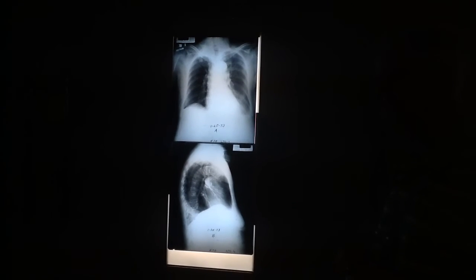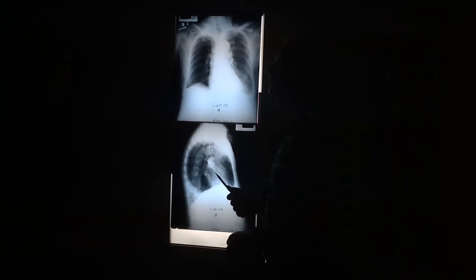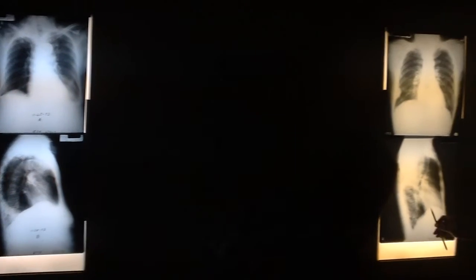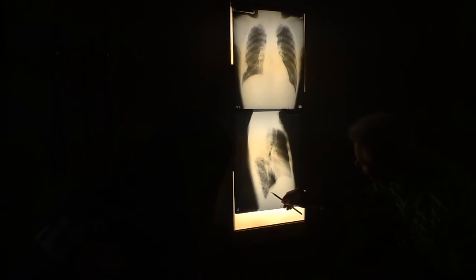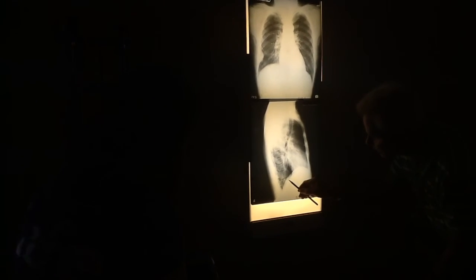Can you just quickly, with your pencil, show what it would look like when I see both of them? Sure. That one on the bottom? Yeah, you can see which one is this. So that would be the right. See, it goes right over the heart. And then if you look closely, you got the other one right there. It stops right here. Why? Because it's touching. So we know that's the left one, this is the right one, because it's continuous over the heart. And that's how you know, because they're not touching each other.